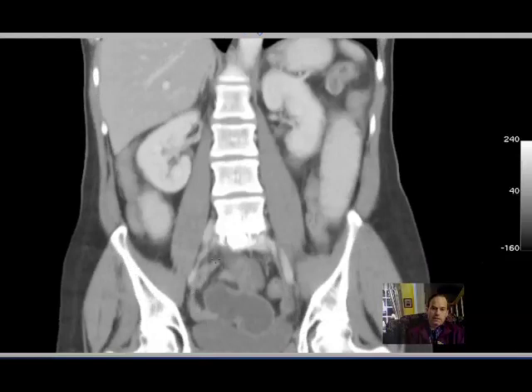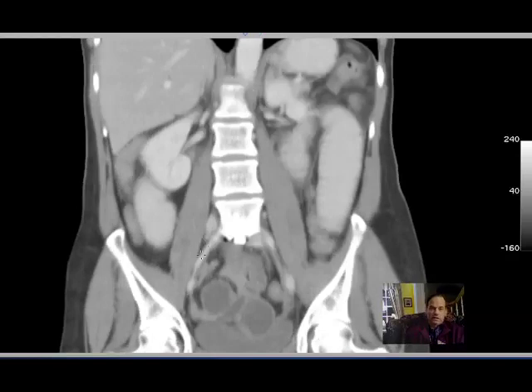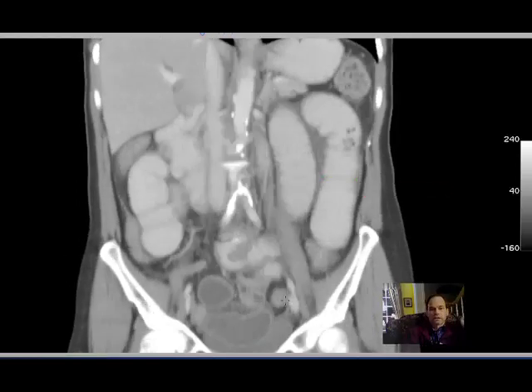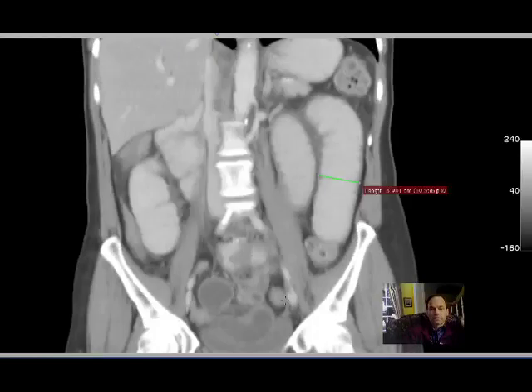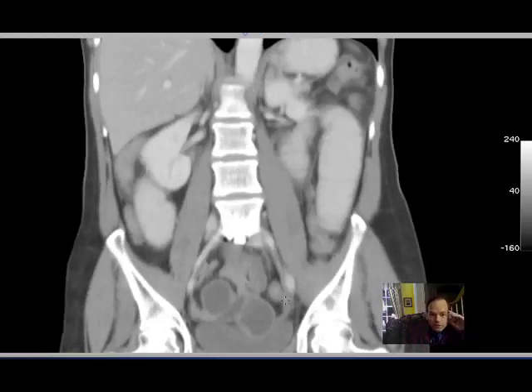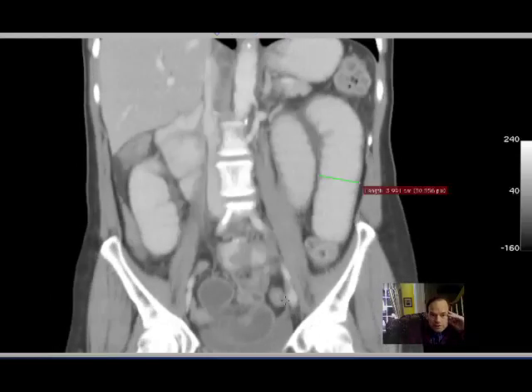And the branch that the common iliac artery gives off, and it may be hard to see here, when it branches, it sends off one external iliac artery that continues as the femoral artery, and it sends off a deep branch, which is the internal iliac artery. Let's see if we can see that. See, the nice thing is that basically everybody's got these things, and it's just a matter of looking for them and finding them, and sometimes it's harder than others.